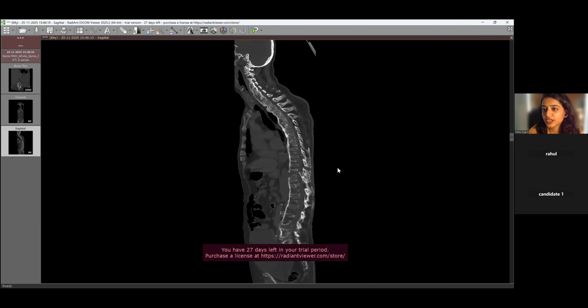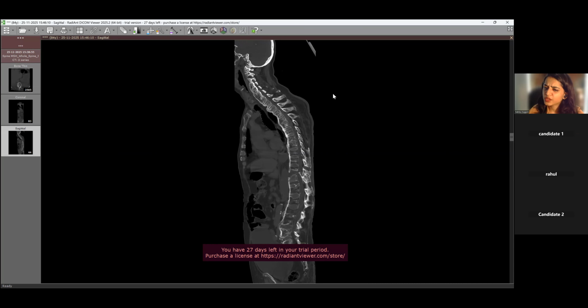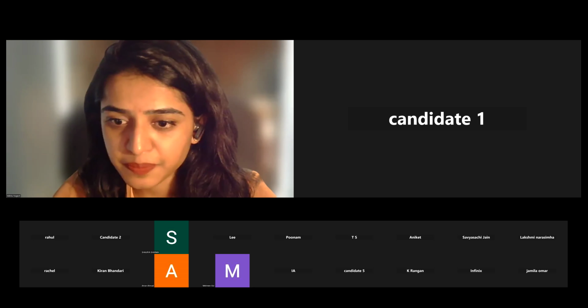But it was good that you picked it up on the MRI itself. And you asked for a comparison with CT, right? I didn't ask. You can say I will correlate with any prior image or radiograph because that will solidify it more. Suppose you didn't have the cervical spine, then it was even confusing for a spondylodiscitis kind of picture if you hadn't looked at the cervical spine. But I think your pace and the way you speak, you are including all the negative points also. So that was good. And coming to the first case.